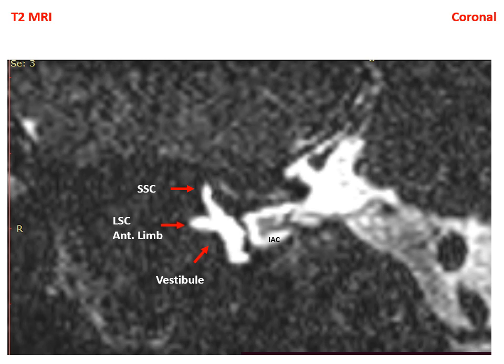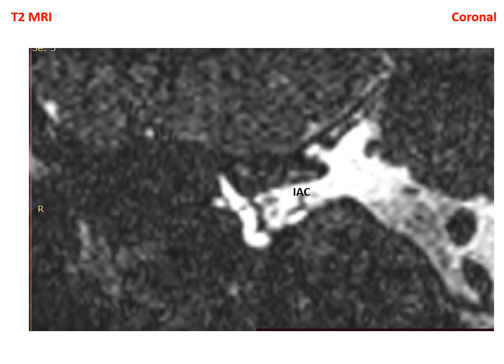In this cut, we can start to see the internal auditory canal. And we can see the nerves. The facial nerve will be more anterior. The cochlear nerve will be more anterior. What we start to see is the superior vestibular and inferior vestibular nerve. So again, the vestibular nerves, superior and inferior, are posterior. The facial and cochlear are anterior. Facial is up, 7 up, and the cochlea is down.